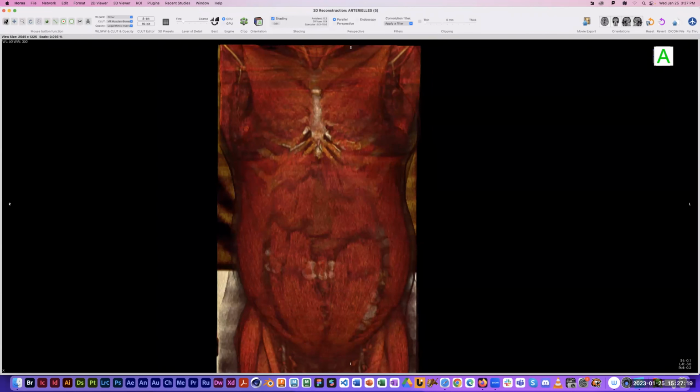So I'm going to select that window level tool. The way this works is that you can drag with the tool left or right or up and down, and it will alter the transparency of different tissues. Now, a word of warning about this: make small movements. Don't drag the thing way off the edge of the screen, because it'll make such a big change in the transparency that the image is likely to either completely disappear or just turn into a bunch of static that's unrecognizable. So you want to generally make pretty small movements and gradually change the transparency.